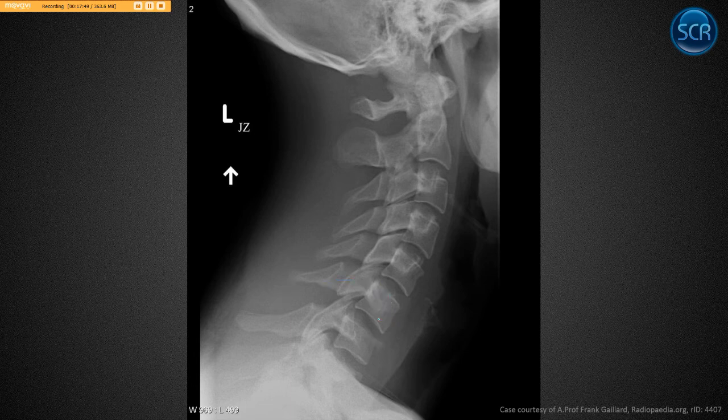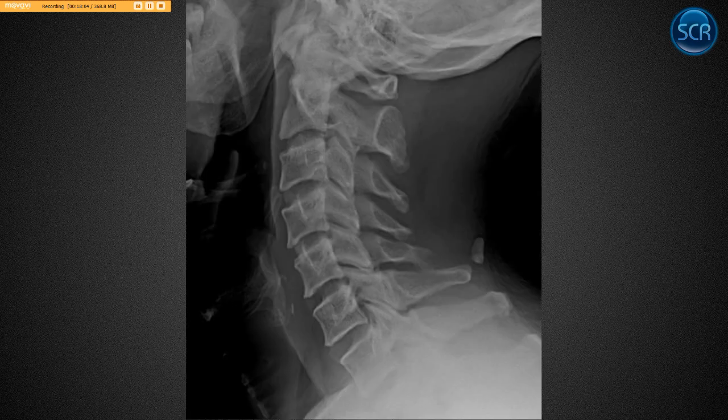So this is a flexion injury. This came down here, smashed this anterior vertebral body corner, and look what happened. They dislocated their facets as well. So this is bilateral perched facets in association with a flexion teardrop fracture. This is a grossly unstable injury. Neurosurgical consult and MRI.